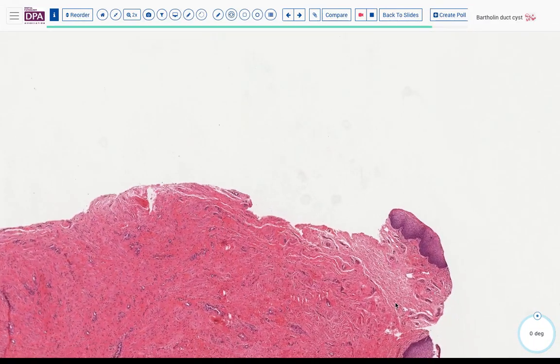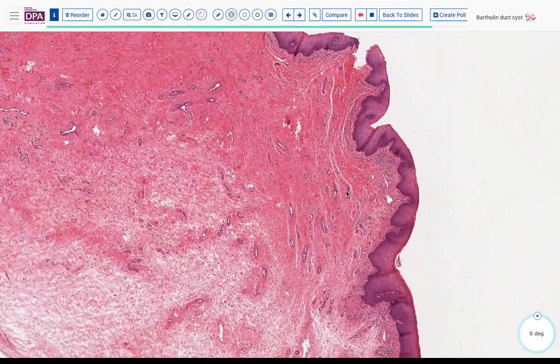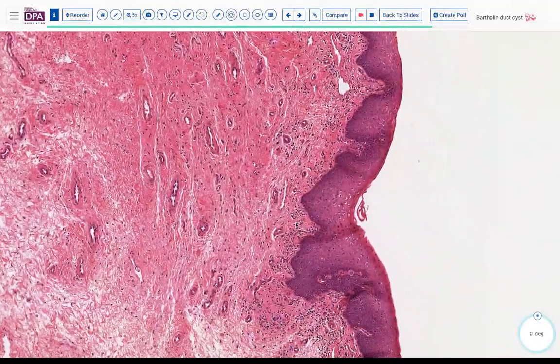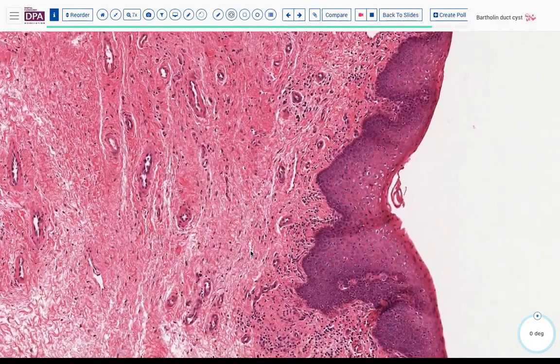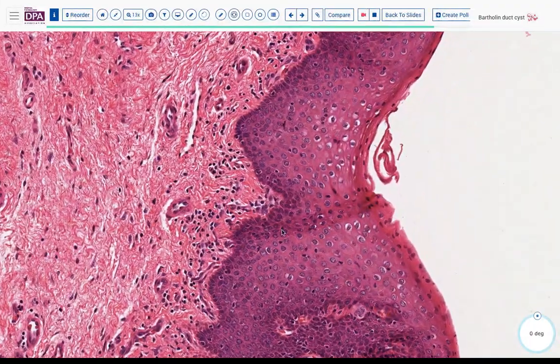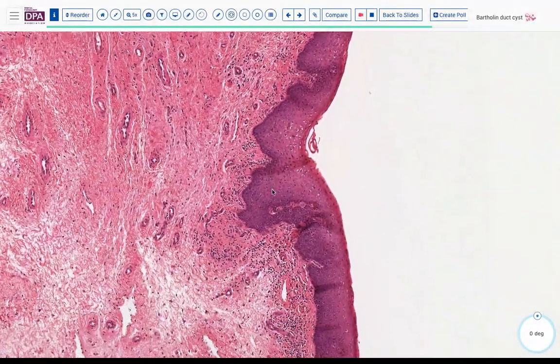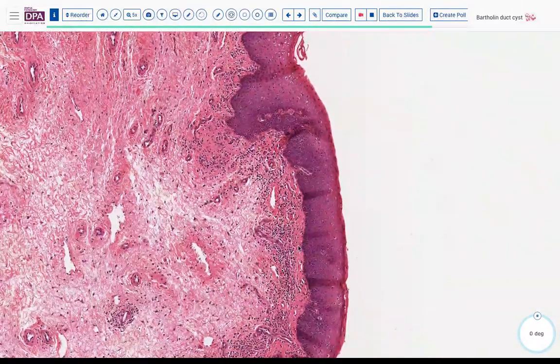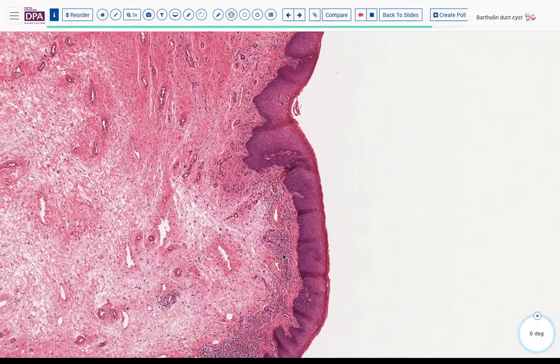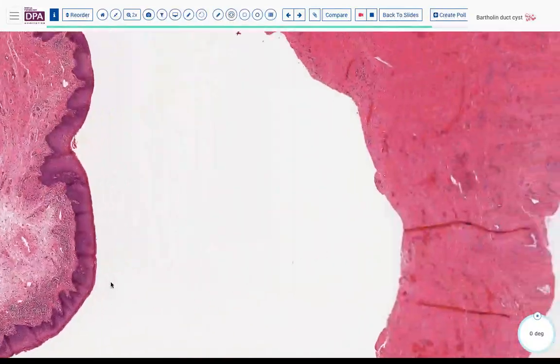And here we see more squamous mucosa, fibromuscular stroma, no keratinization, no viral cytopathic effect, although here you might say there's a little pseudo-koilocytotic change, or maybe some of you might wonder about a true dysplasia in a location like that, and a little bit of inflammation as we move more towards the surface of the vagina.